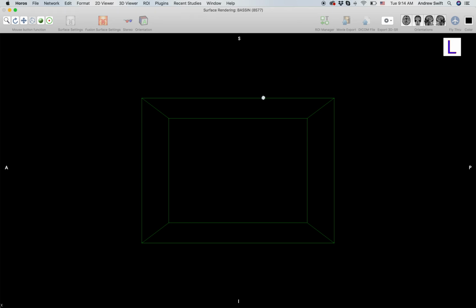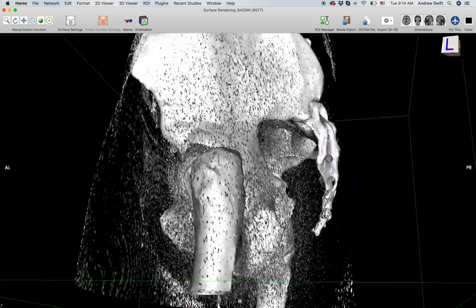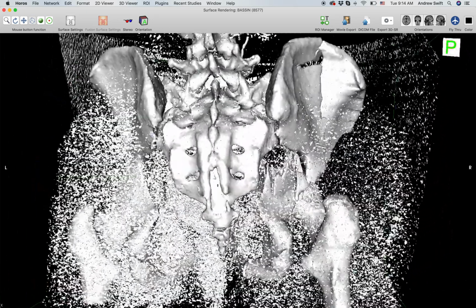Once it's finished, we're going to click Export. From this dialog right here, we're going to export as an .obj file and send it out for use in ZBrush. This is taking forever. If it fails to do it pretty quickly, I'm just going to end the movie. There we go. That looks pretty good.